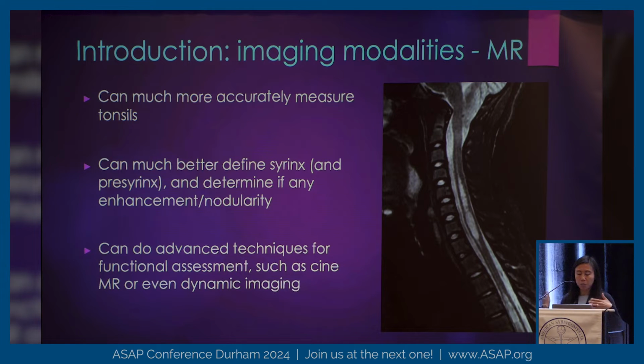And it just means that we suppress things to make it dark, so it's easier for our eyes to find abnormalities. So the fat under the skin and the fat in the bone is dark, and anything that's bright, other than discs, which are between the vertebrae, potentially could be something concerning. Like in the cord here, there's a syrinx. So this is the normal cord, and then we get this sausage-shaped area of bright signal. So that is a syrinx.